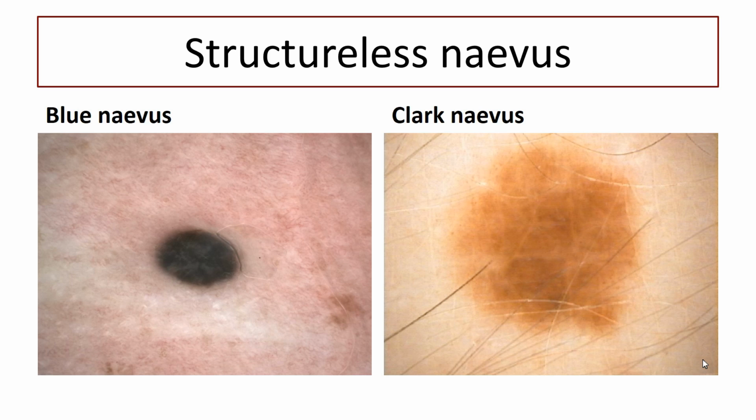So remember that. Because a normal Clark nevus or dysplastic nevus has no atypia. It's typical of that. Now, its pattern is dysplastic, but that is its pattern. And it has a pattern. They can change. And we showed how they get dots around the edge and they expand. That doesn't make them malignant.